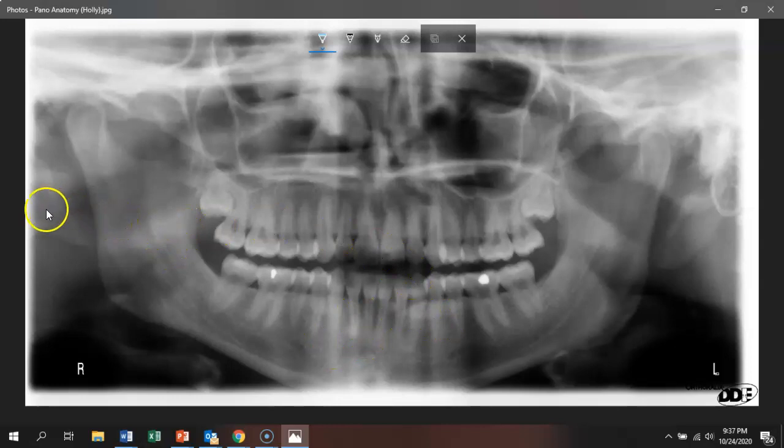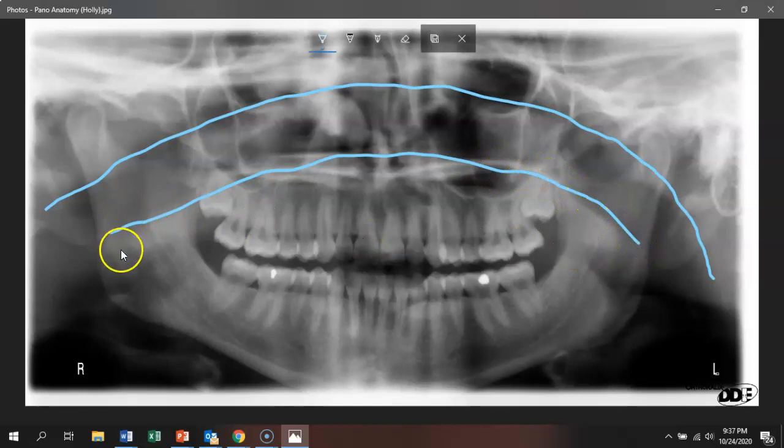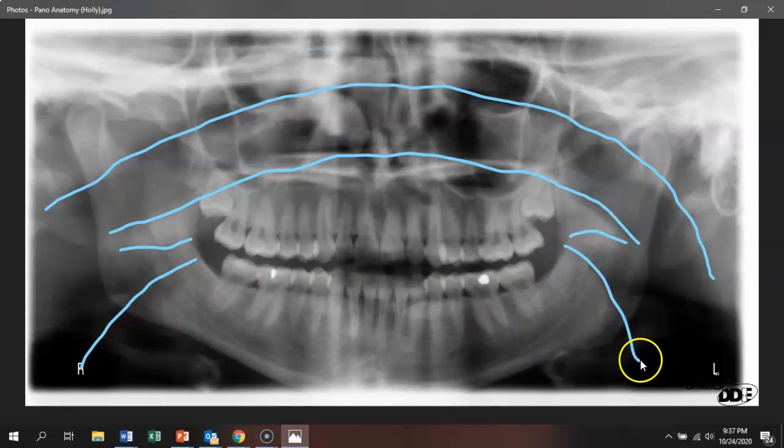If I were to generalize it, you can see the nasopharyngeal right through here, and then you can see the glossopharyngeal right through here. Do you see how that whole area is a little bit darker? So those are the areas.